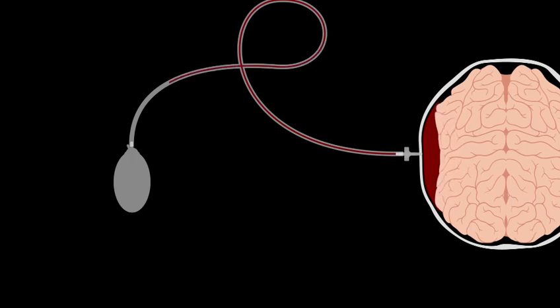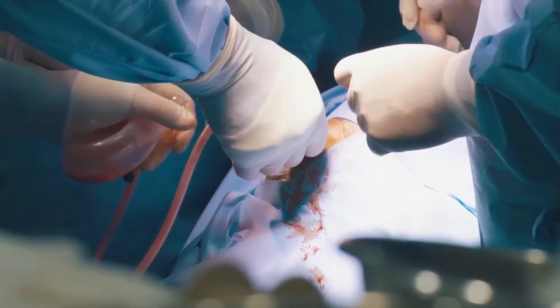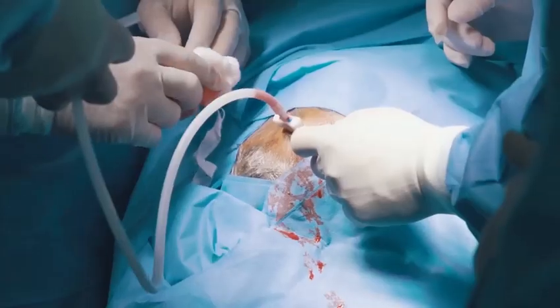The NASP is threaded to the skull and connected to a 60 centimeter long silicone tube and a 100 cc suction bulb. The bulb should be squeezed side to side and closed to generate negative pressure. Squeezing the bulb bottom up generates very little negative pressure, -3 millimeters of mercury versus -111.6 millimeters of mercury. Although the pressure generated by a fully compressed empty bulb is high, a 60 centimeter long 16 French NASP tube will decrease fluid flow rate, or pressure difference between the bulb and subdural space, by approximately 85% based on the literature.